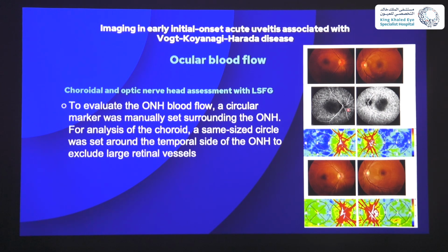So this is a patient at presentation. Then we have a color scale. Blue means very low velocity, and red, high velocity. Now, you can see this is an example of a patient. This is before treatment, and this is after treatment. So what kind of change happened after treatment? Green. The color changed. It became green.